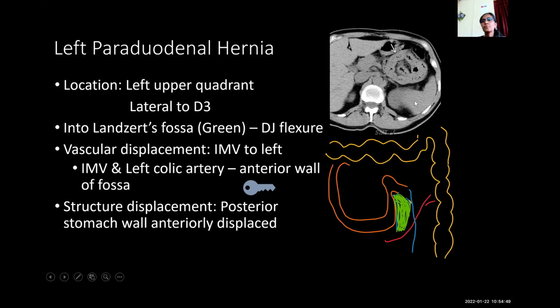So this is an image. At one look, we don't have to know what type of internal hernia this is, but we know, hey, it's a cluster of small bowel loops. We have no business to be where they are. There are some clues, in case we did not realize. You can see that the bowel wall is thickened. This patient should have had small bowel obstruction, and you can see that the mesentery is not looking good.